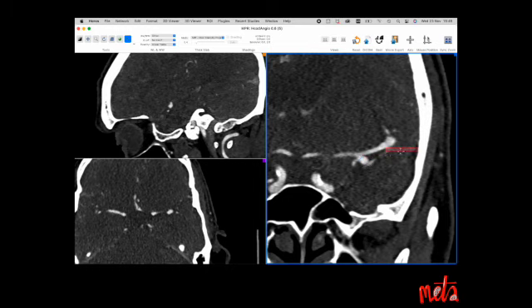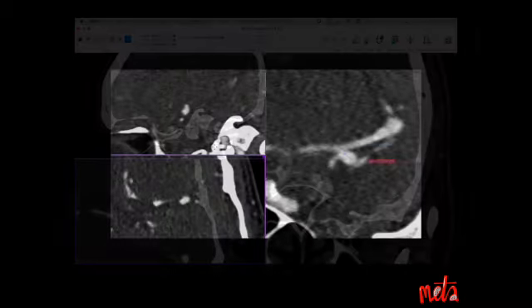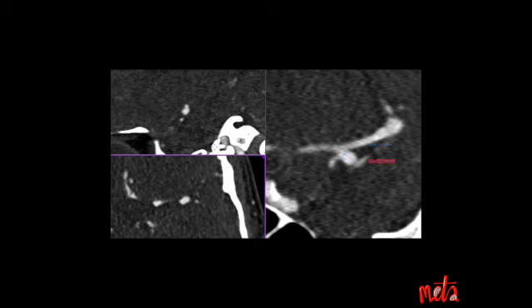That allows you to draw or measure the neck, as has just been shown there, and then in the same plane measure the height, which is perpendicular as we've previously shown. The final measurement you do then is perpendicular to the height, which is the diameter, which is shown here in the screen grab by that red line. And those are your 3 measurements.